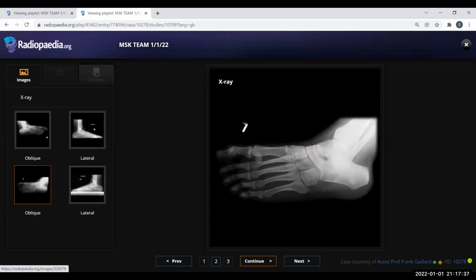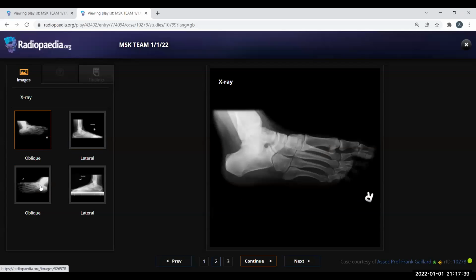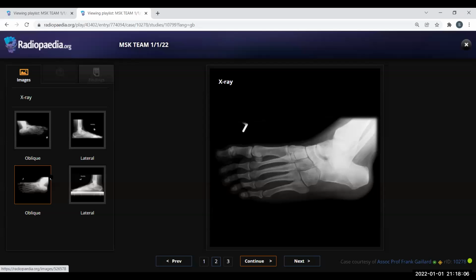Yes. Now the question is, you do not see the proper fusion, is it? Yeah. You can see the navicular separately, and you can see the calcaneum separately. So the question may arise: how are you saying that this is coalition? Why is this coalition? Because I can see the joint space of the rest of the bones, right? They are very clear. There is no sclerosis at the end plates, at the articular surfaces. But here, there is sclerosis. So this is the sign of coalition.